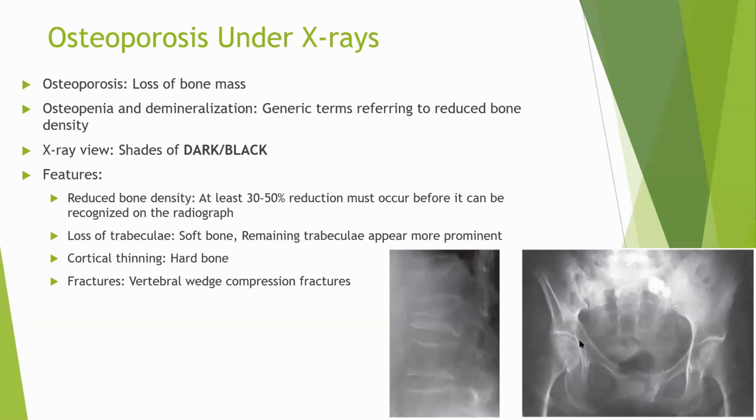That's why the complete head is whitish in structure, and the acetabular capsule, labrum, is completely eroded, degraded, debrided off. Everything is gone right over here, and you can see that this bone is impacted, pushed into that acetabulum. There are many other things that I can see, but for the purposes of osteoporosis, this is unfortunately a completely dark ischial ramus, the pubic area completely dark, suggesting that probably there is huge osteoporosis.